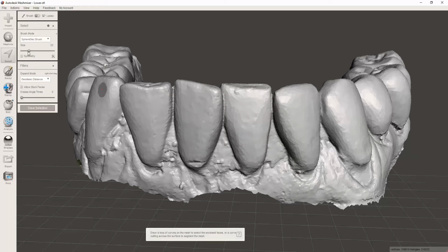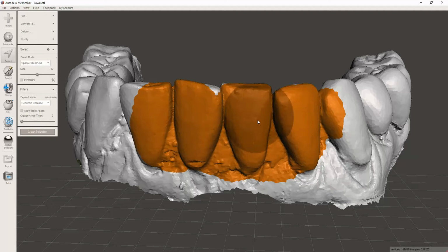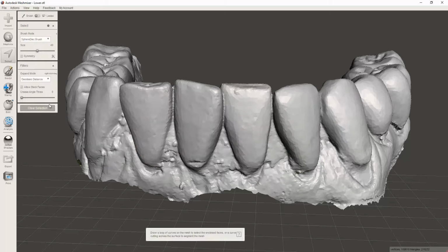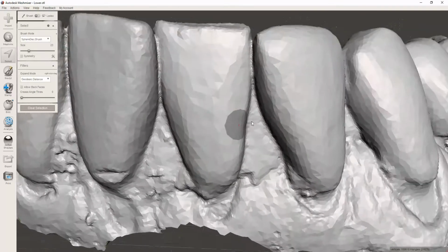First of all, when the software first opens, it tends to start with it right at about 50, right in the middle. It's a very big area you're selecting. Of course, this doesn't really help when we're trying to be precise, but to give you an idea of how that works, I'm going to hit Clear Selection, or you can just hit Escape. And I'm going to change this down to around 25, that area. This gives me a fairly workable area, maybe just shy of 25, where I can kind of get into the areas and it's not so small that I'm taking forever.